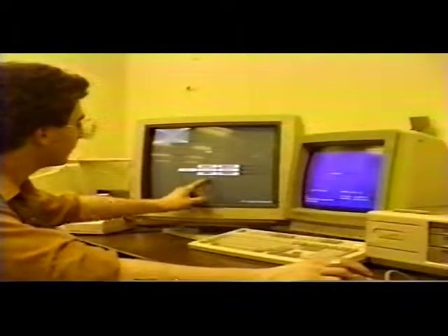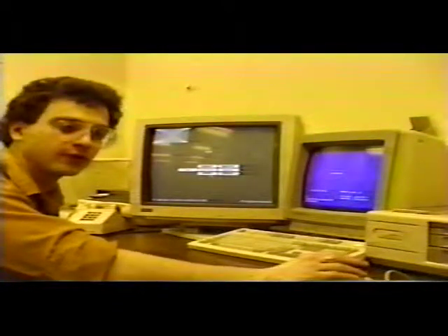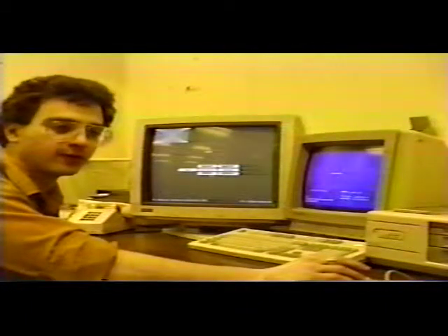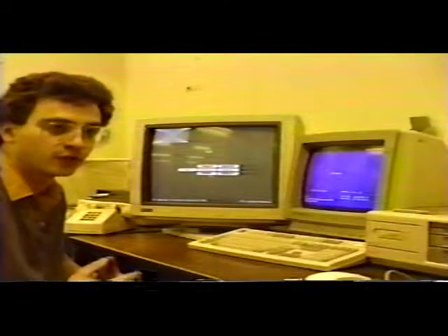We also have the ability to copy information from one optical disc to another. We can make duplicates of a disc, or we can take studies that have been held and save them out for new studies.